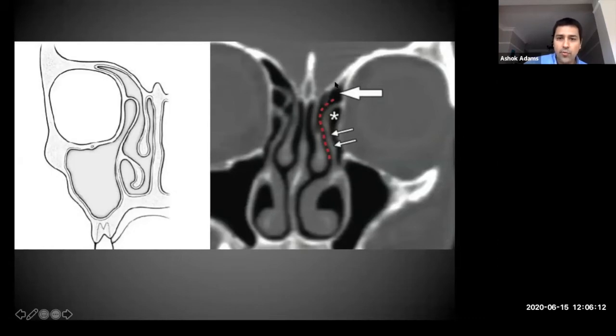Then as I move on, we'll typically comment on whether the frontal sinus drainage pathway shares the same drainage pathway as the ostiomeatal unit. So that relates to now moving on to the ostiomeatal unit, looking really at the uncinate process here. So looking as to whether that uncinate process will attach to the orbital wall, or whether it attaches to the anterior skull base or the nasal septum turbinates. So you can see in this patient the uncinate process here attached to the medial orbital wall.